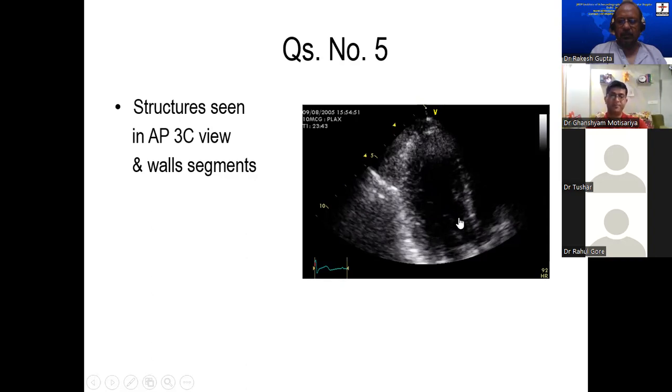Anterior septum. This is the aortic wall, LVOT aortic wall. This is not the aortic wall, this is the mitral valve. Oh, that too, sir. Yes, mitral, and the lateral side, that will be the aortic. Correct. And what is this? That will be the RV, sir.